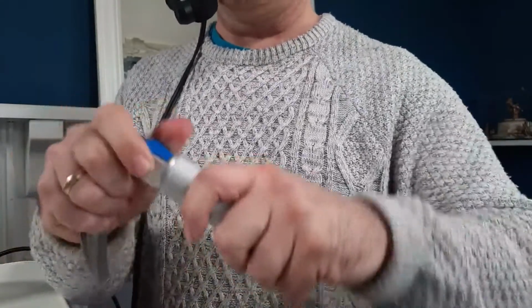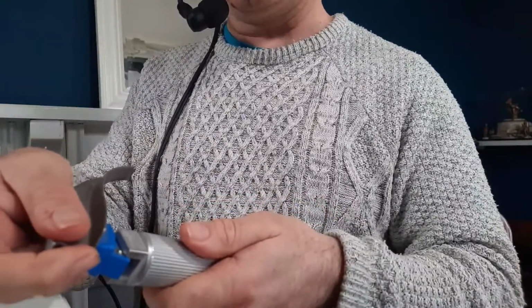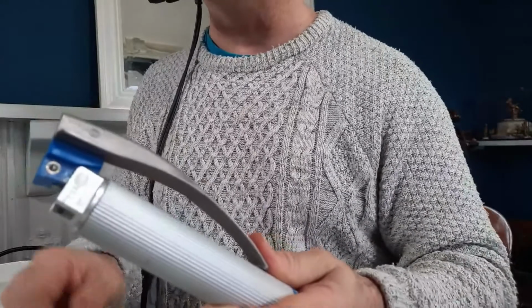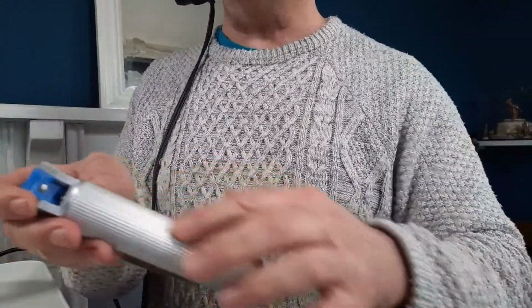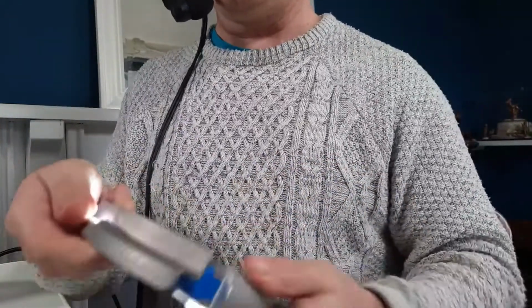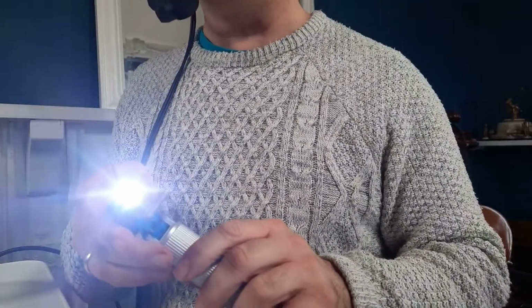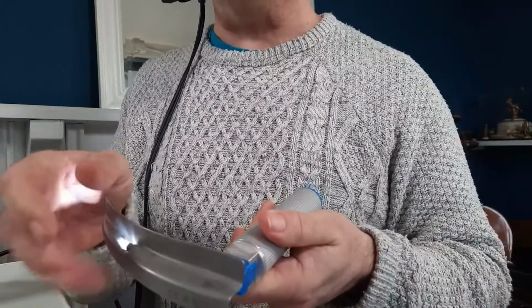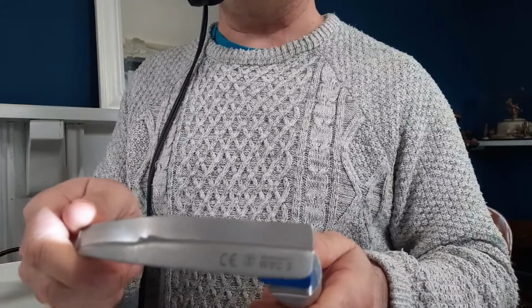The laryngoscope should come apart, he says. Maybe this is the kind that doesn't. Oh no, this is the kind that doesn't. Okay, so this is a disposable one, so actually this blade doesn't come apart. This is a Mac 3 blade. You've got your power source stored in here, the batteries are in there, and then when you open it, you should have a nice light at the end there. Sorry to dazzle you. These used to be little bulbs that you could screw in and screw out a long time ago, but that's not something we have now.